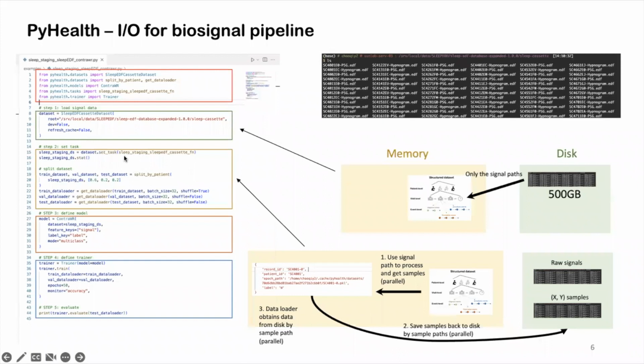But this staging function, basically, we transform a super long recording into multiple 30-second segments, and each segment will itself be a machine learning sample. And you will write those 30-second intervals into a separate file back to the disk? Yeah, I will write it into a separate file and back to the disk. Okay. And the output folder, all those things will be specified somewhere in your function as well. Yeah, it will be specified somewhere.